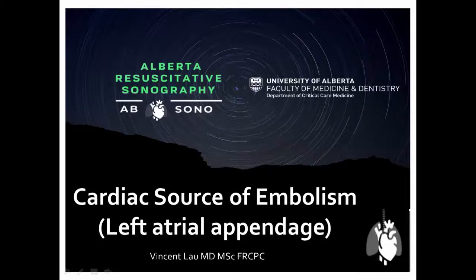Although interrogation of the cardiac sources of embolism is an advanced skill and requires some extra training, I will be introducing the principles of looking for a substrate for cardiac sources of embolism, including looking for spontaneous echocontrast, low flow stasis, as well as interrogation of the left atrial appendage specifically to look for clot. Hopefully this screencast will calm some of your fears about advanced applications of TEE and help with a good foundation for you to perhaps start performing left atrial appendage interrogations in your own practice.